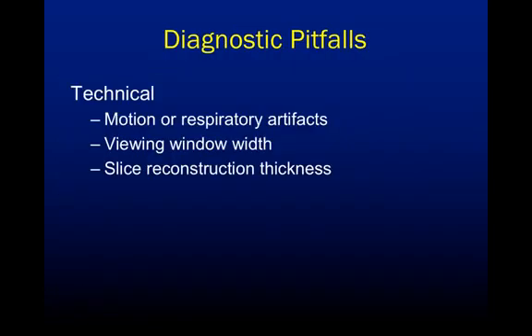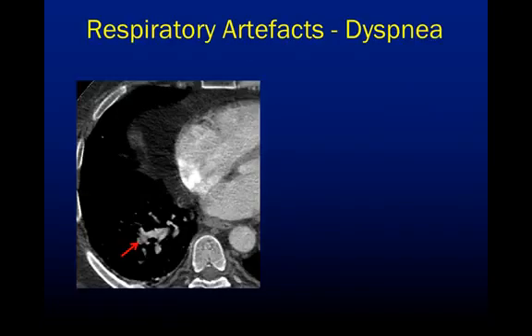Another group of pitfalls is the technical group. These are relatively common, especially motion or respiratory artifacts. The viewing window width is important, and the slice reconstruction thickness is important. Respiratory artifacts are due to dyspnea.